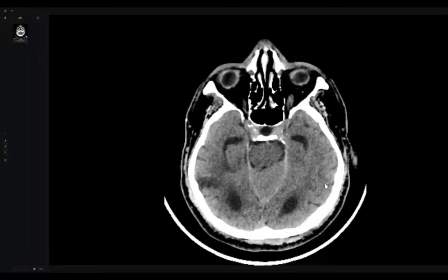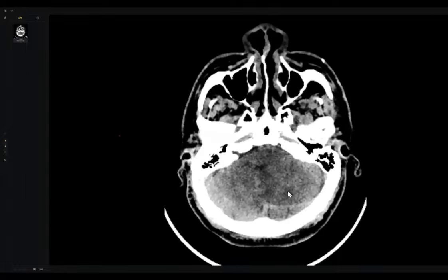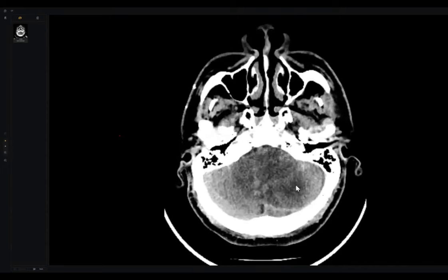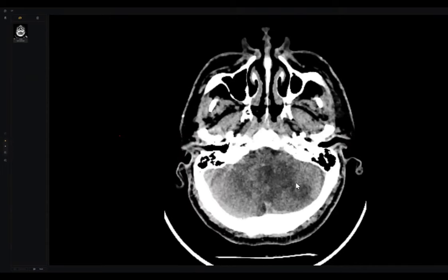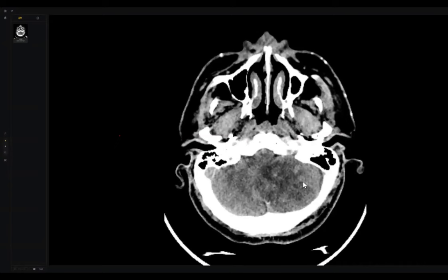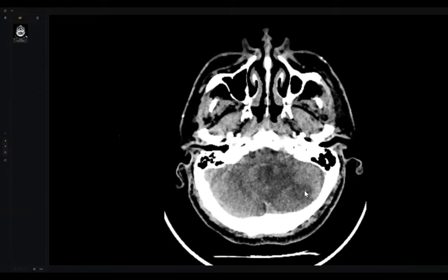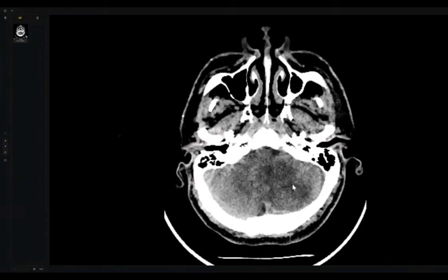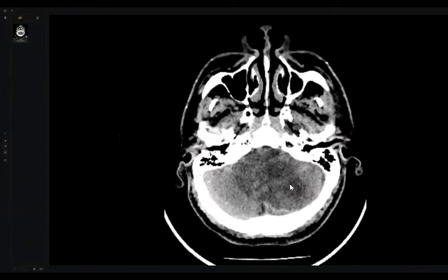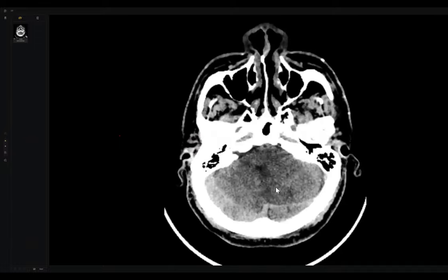Okay. So there is a hypodense lesion in the left cerebellar hemisphere, also involving the vermis. What is your differential here? It is quite heterogeneous. It could be a primary brain lesion or could be a metastasis. I would like to see further MRI images of the brain to confirm it. And it is also effacing the fourth ventricle, causing proximal hydrocephalus.